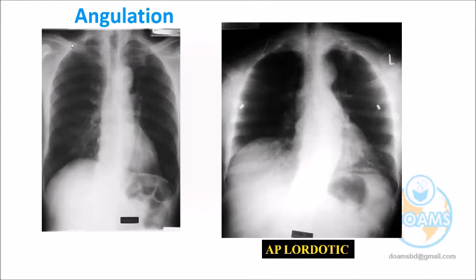You see the clavicle in the upper part here. The apex is visible in a very small area, with crowded bones. But here, can you follow my cursor along the clavicle? This is the clavicle. So you see, the apical area is bigger.